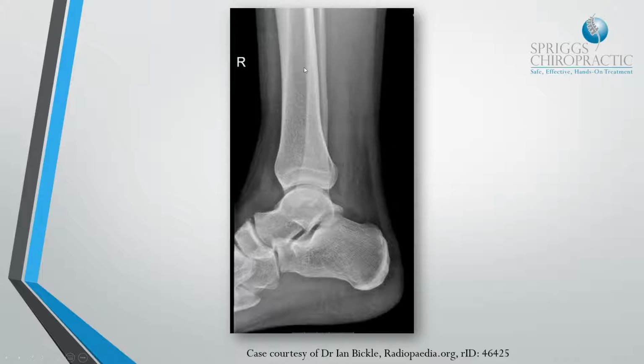And here we are. So we have distal tib and fib superimposed on top of one another. You can just about make out the lateral malleolus just there superimposed on everything else. And here is the domed aspect of the talus, the body of the talus just here. So you can really appreciate the shape of the dome. So when you're looking at it through basically an A to P projection just here with the mortise view, you'll see as the central beam hits here, this will therefore appear flat, so it looks like a box, but it isn't. Obviously, it's a domed or curved top that you're looking at.